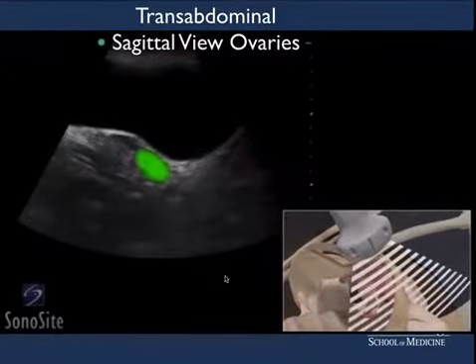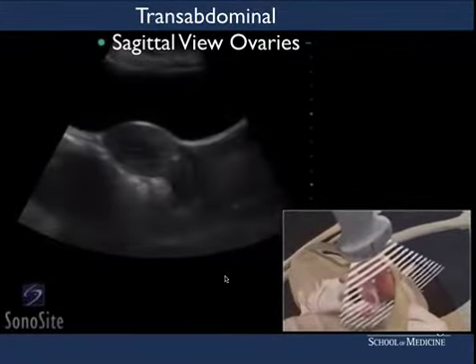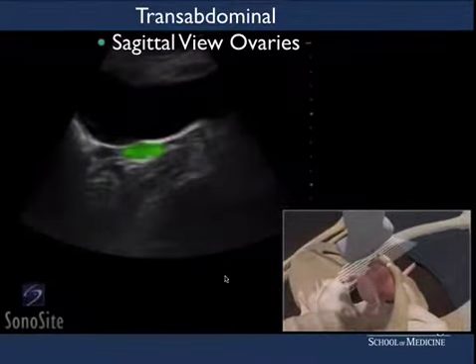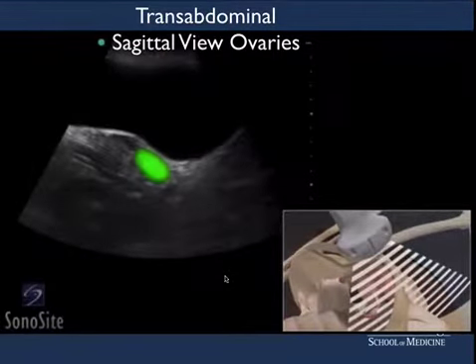This is another example of transabdominal sagittal view of the uterus and ovaries, and where we may find the ovaries posterior to the uterus in a sagittal view.